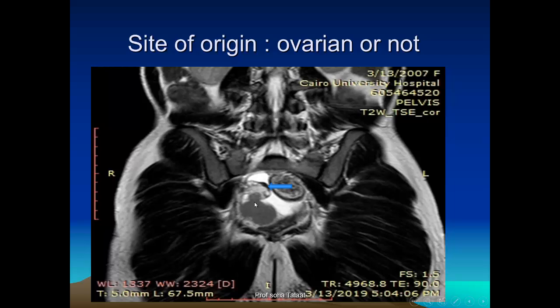So here, I say that it is not just an ovarian mass. It is an ovarian mass, likely germ cell tumor, because it is arising from the follicle itself, and it is compatible with the patient age. So this is an ovarian exophytic soft tissue tumor. Of course, in this case she has a very huge mass on the other side, but it is important to detect bilaterality and to know the site of origin of these lesions.